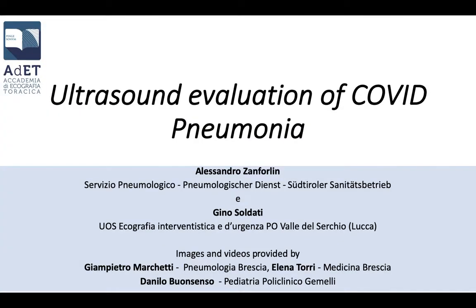Hi everybody. In this presentation we will see an overview of the use of ultrasound for evaluation of COVID pneumonia. Thanks to Soldati that helped me in making this presentation, and thanks to the authors that gave me some videos and images.